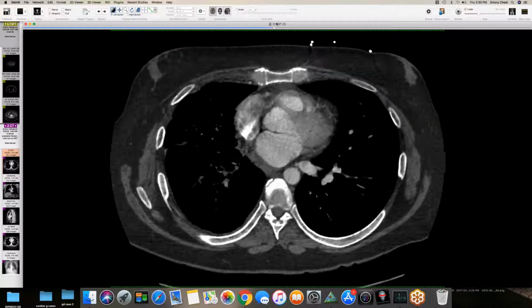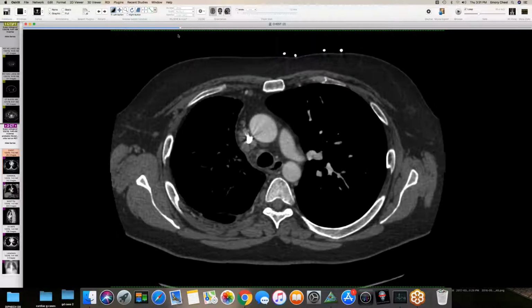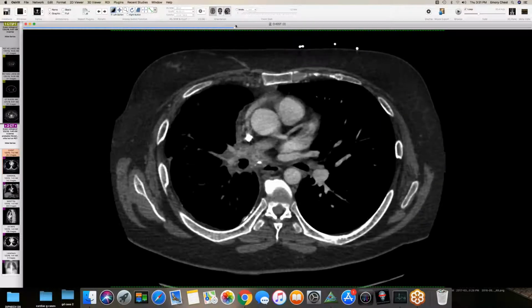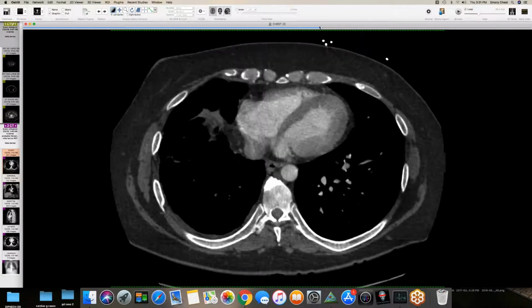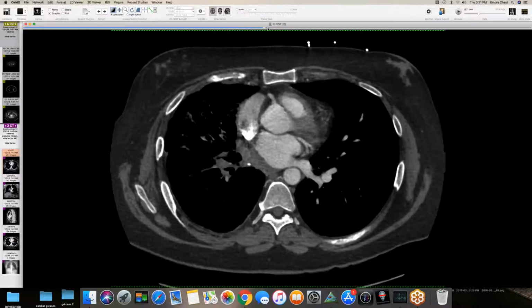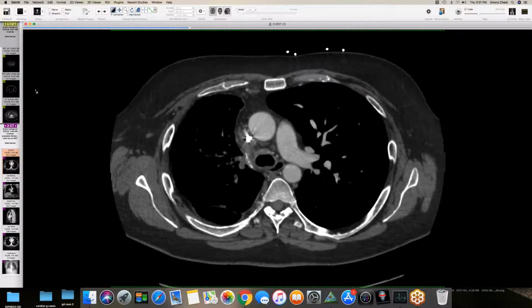Yeah. I don't know if a lot of the volume loss is due to a fibrothorax or if it's just from the chronic venous congestion, because sometimes you see that too. These fibrosing hilitis, mediastinitis lungs just scar down. Yeah, I guess as an ischemic response. A combination of all those things, perhaps. I think we're all agreed that this is a fibrosing hilitis, and I think you're probably allowed to have a little ongoing inflammation in those nodes. They didn't look that angry to me that I would invoke some separate process.